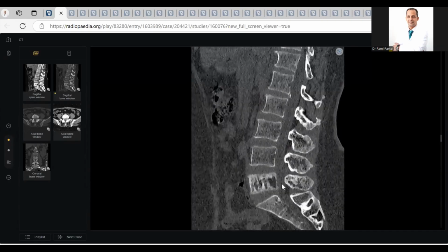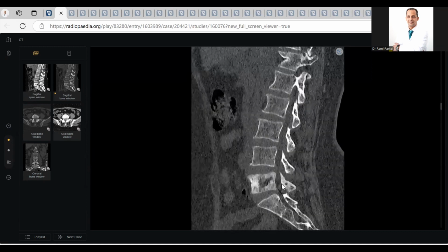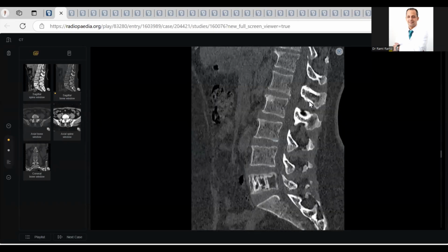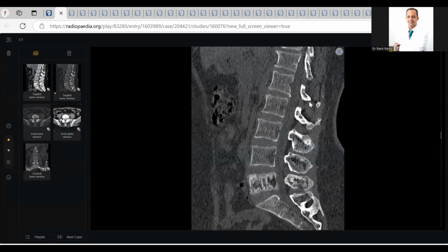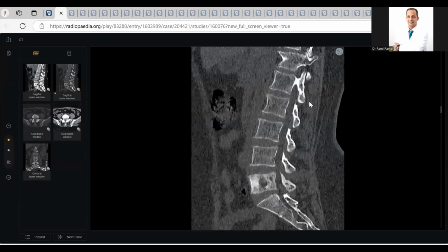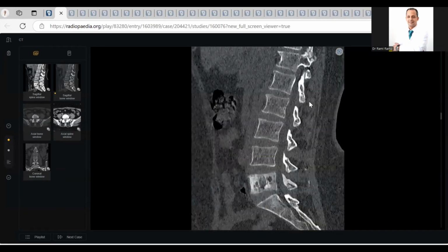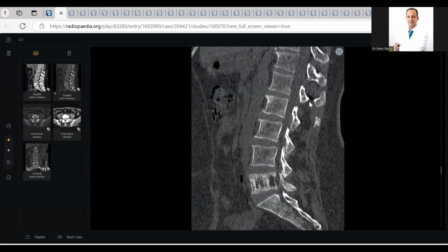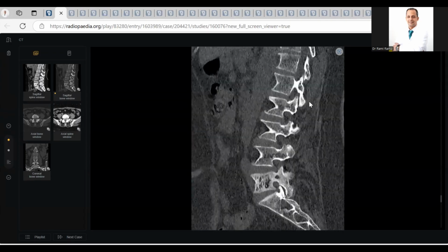In this bone window, I can see some thickened trabeculations and areas of mixed sclerosis and lytic foci. Give me a differential. I would also consider vertebral body hemangioma. What else? Because of the history of breast malignancy, metastasis has to be ruled out.